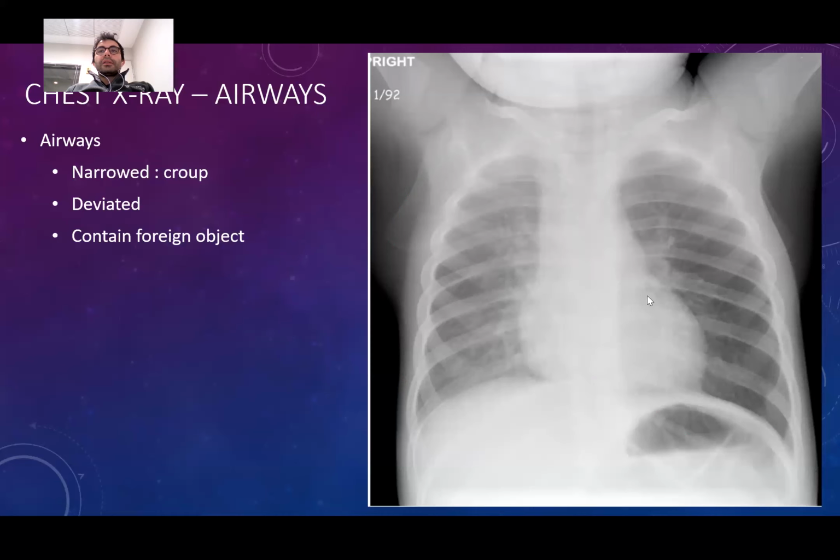When the foreign body is obstructing the airway, it is blocking the outward flow. The inspiration is working in this patient, but the expiration is not working because the patient is trying to push and it is blocking the way. These patients, because they are very small, like 1-2-year-old kids, cannot say what happened to them. They will usually just be agitated patients, crying, and that's all. So you have to figure it out yourself. And if you don't recognize this asymmetrical appearance, you cannot get to the diagnosis.